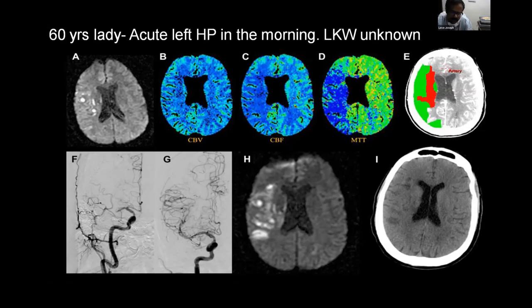In CTP, you inject the contrast and your brain is scanned repeatedly. One scan is called one dynamic. Given the speed of the current multi-detector CT scans, it is possible. So 22 dynamics typically in our institution, we take repeated dynamics and see the pattern of contrast from the time of injection, how it arrives to the brain, which areas are under perfused.